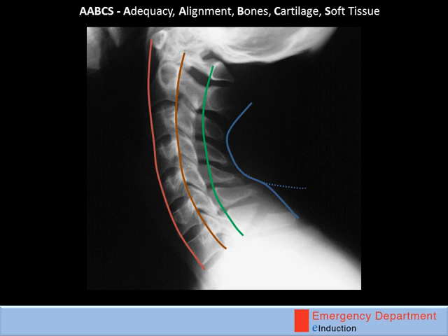Looking over your review areas to continue your assessment, your Harris's ring, your predental space, they all seem normal, and your C1-2 alignment reveals no other pathology. The disc spaces look uniform, and the soft tissue doesn't have any problems. So, congratulations if you managed to spot that fracture. It's one that's easily missed, especially on a busy night shift with lots of patients waiting to be seen.